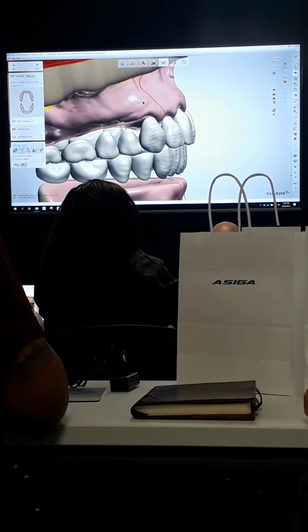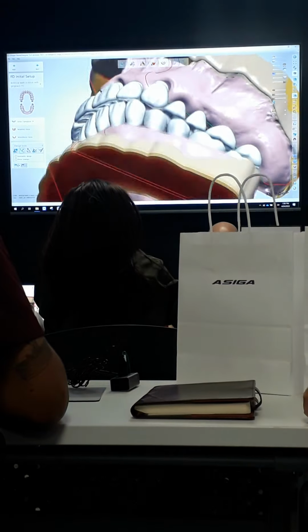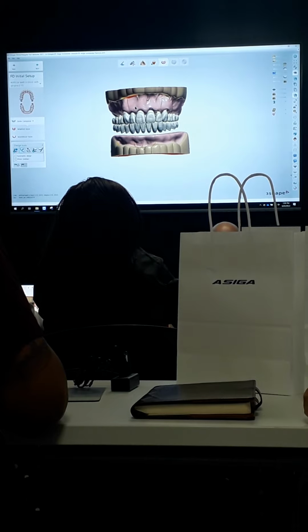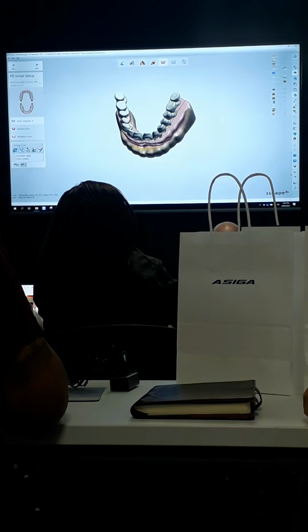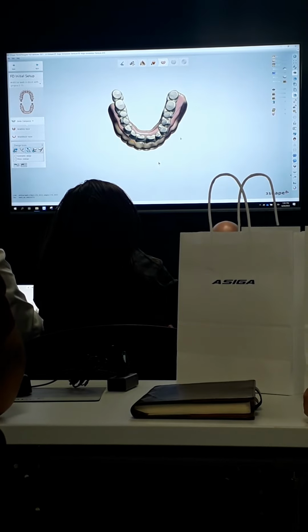I can see I'm still over my ridge on the lower teeth. Upper teeth look like they're in good positions, but let's just say now I'm looking at it and I don't like the buccal corridor. So I'm going to turn off the upper, look from this view, and switch to this tool here. Now, the main difference between this tool and the tool we just used is that this tool does not snap things back together. Wherever you move it is where it sticks. So I don't have to worry about that rotation or anything like that.